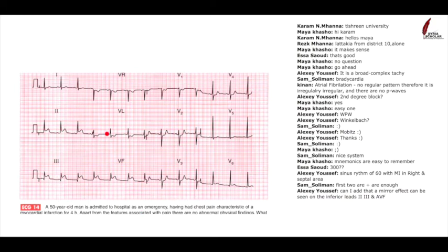I'm going to give you some options. First of all, if there's a problem with the ST segment, is it in the inferior part of the heart, is it in the anterior, or is it in the lateral part of the heart? So where is the problem in this patient's heart?